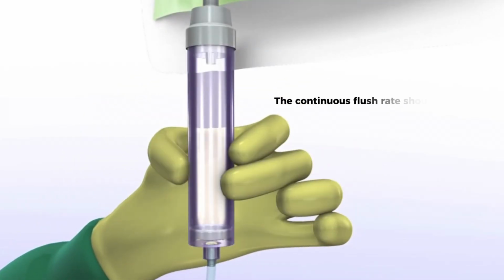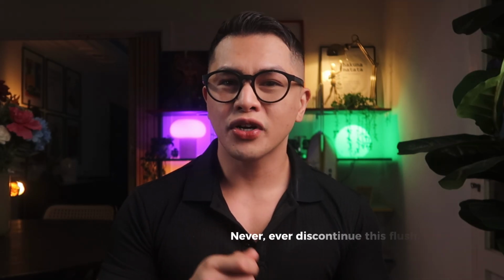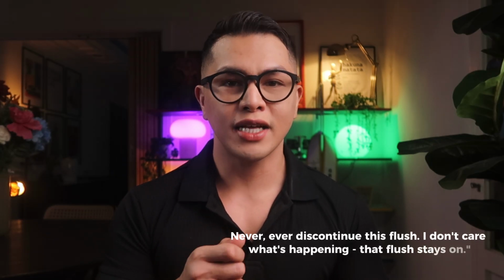The continuous flush rate should be 3 to 4 ml per hour. This keeps the line patent and prevents clot formation. And here's a pro tip. Never ever discontinue this flush. I don't care what's happening. That flush stays on.